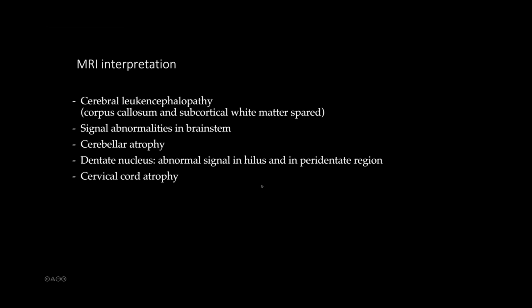To summarize the finding, there is a cerebral leukoencephalopathy with sparing of the corpus callosum and the subcortical white matter. Signal abnormalities in the brainstem and the cerebellum with cerebellar atrophy. Dentate nucleus changes were seen predominantly in the hilus and the peridentate region, and there is cervical cord atrophy.